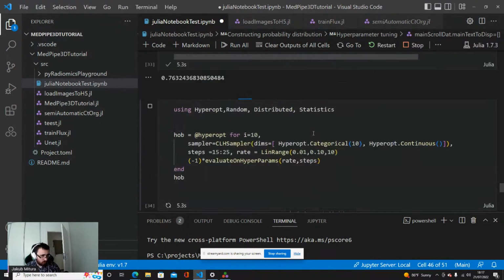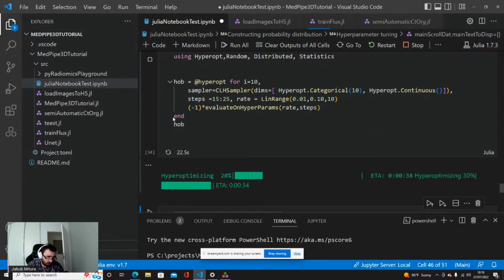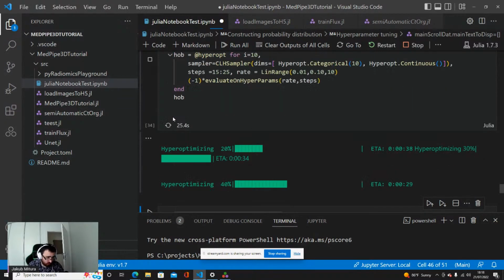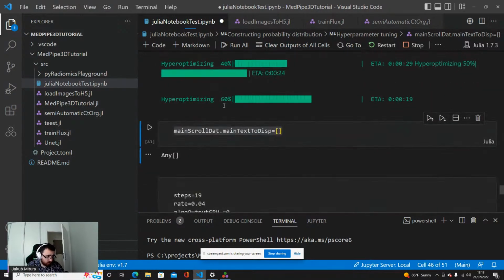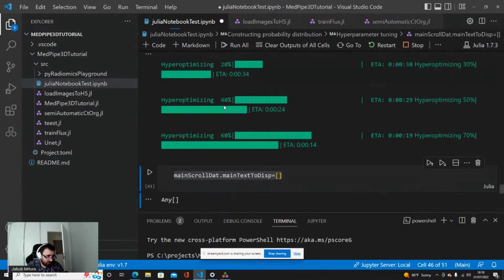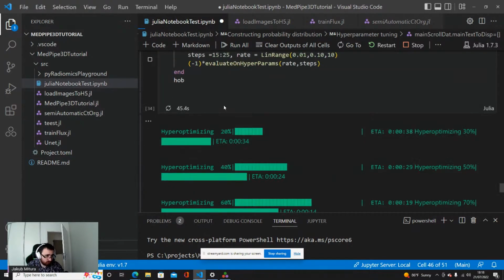And here it also shows why it's important for this algorithm to be relatively fast. Because in order to do any hyperparameter tuning, we need to execute the whole algorithm multiple times. Here I'm just defining 100 different points. Not all of them are executed, at least I suppose so. But still, it's multiple executions of the same algorithm, in order to find the best configuration of the hyperparameters.